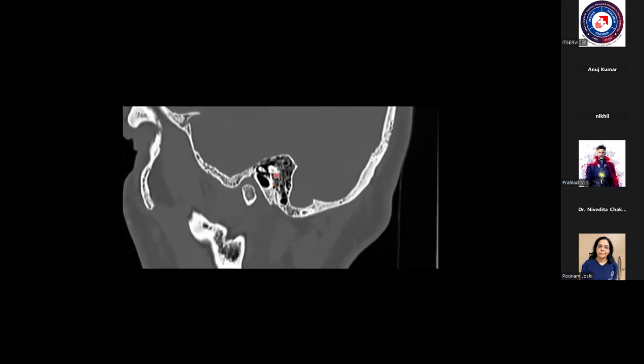above. And these are the semicircular canals, and these are the malleus and incus. So posterolaterally is the incus. So the posterior one is the incus, the anteriorly located one is the malleus.